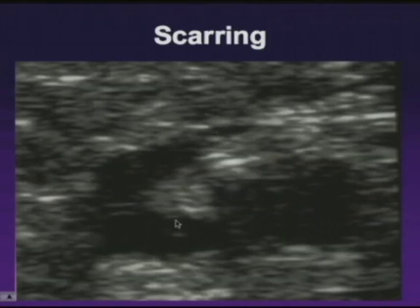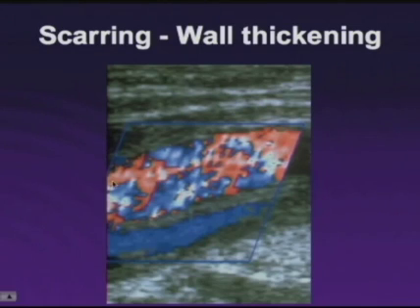In short axis, we can often see many of the same findings in scarring. Again, some of these linear echogenic lines that are present inside the vein represent the synechia, or fine web-like changes, but there is residual material in the vein which has a somewhat triangular shape in this case. And again, what's striking is the irregularity and undulating nature of it and the angulation. Again, this is not the smooth, rounded structures that we expect to see in acute deep venous thrombosis, but rather a somewhat angulated, triangular appearance from scarring and retraction.